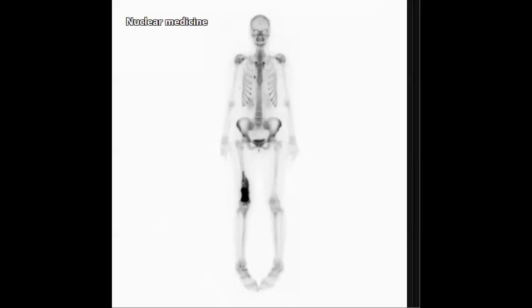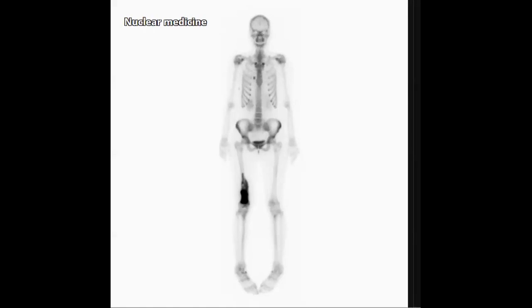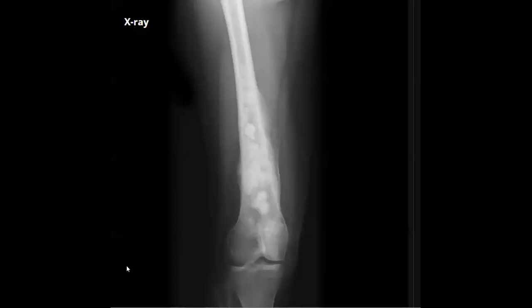Young adult, take care, Dr. Roba. Young adult, take care from the history. Usually check the clinical history. Young patient. Yeah, it can be infection. Can be. Perfect, Fadi. So what is your next step? You have to mention your next step. Yes, what is your next step? What do you think?